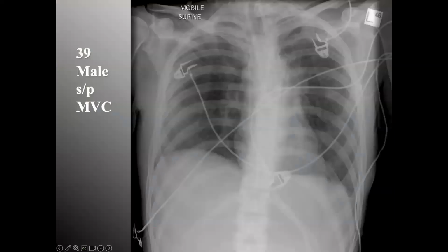So take a moment and let's use our systematic approach. We're going to practice it in real time for the first time here today. Start with your ABCDE. A is airway and adenopathy, B is bones, C is cardiac silhouette, D is diaphragm, and E is everything else.